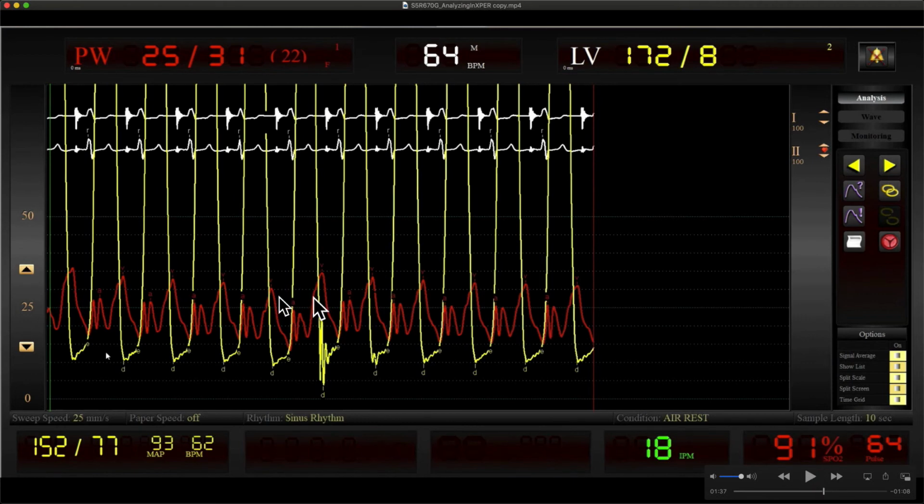Notice that we have artifact in the middle, but all the beats are selected. Here's a red and green. That shows you what's selected. If you don't see red and green, every single beat on the picture is included. We want to exclude that middle beat. So we're going to click and drag some beats that we like. Let's say over there on the right. Okay, now we picked at least 3 good beats here. This one's cut off, will not be included.